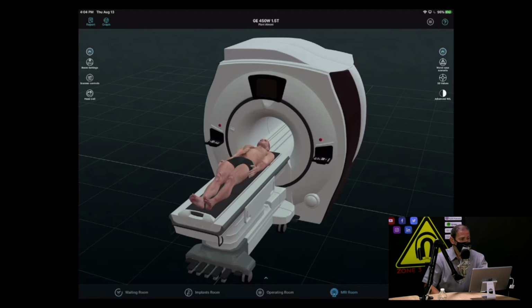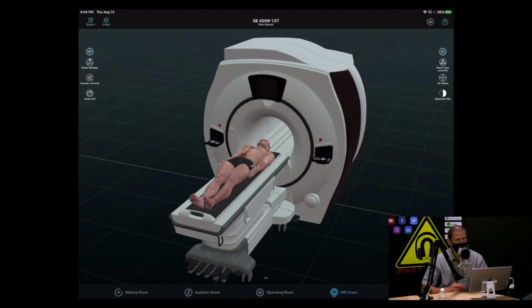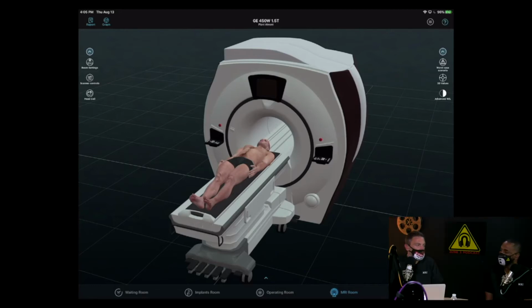So when you say that information, you're talking about the EM fields that we were just talking about, right? With your spatial gradient, your RF gradient, and then your static field? That's the information that is supplied by the vendors? Nice. All the fields and energies that we're about to show, and it's going to be color-coded, and you'll be able to see how strong the fields are in different locations in that bore and different locations in the room. All that information is provided directly by the vendors of the scanners. You collaborated with them. That's awesome.